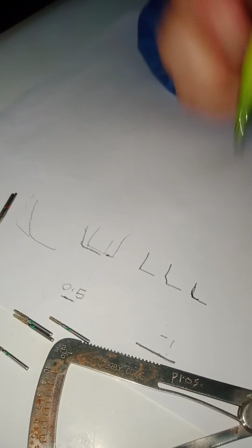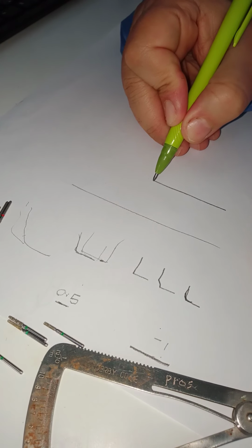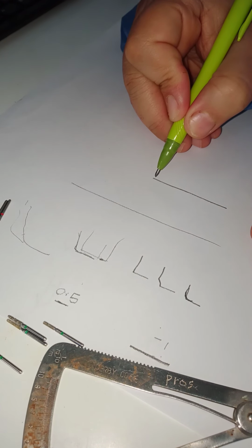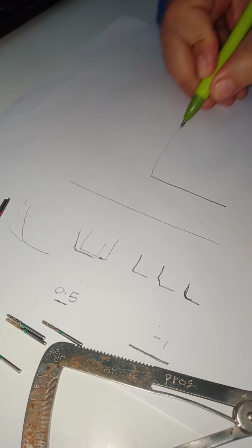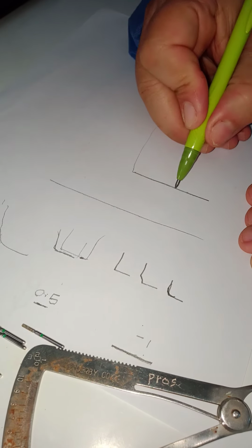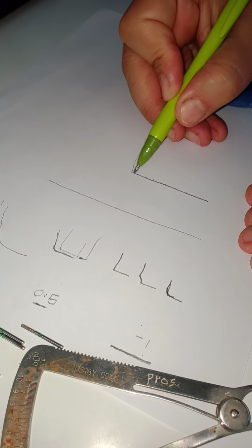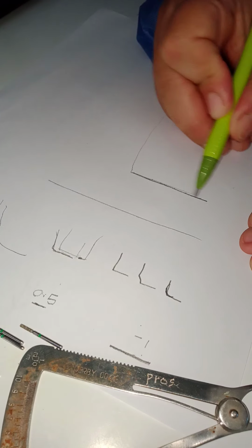Now the last thing I want to say is about the morphology of the gingival part of the shoulder. Okay, this is the shoulder as we know it. Now because with the shoulder we're going deep, that means the bur is embedding in the tooth structure. So what are the problems? Sometimes we have this upright, 90 degrees.